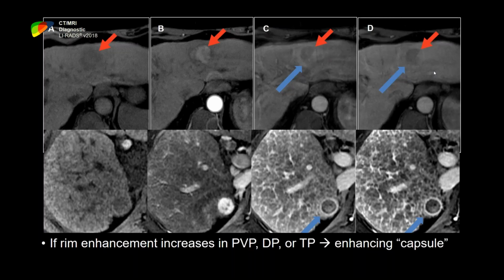I actually have seen cases of hypovascular HCC, and you can still look at the decreased enhancement in the later phases with these cases, and the development of enhancing capsule as well, or appearance of enhancing capsules. So I think this is based on the scenario that you're encountering. There is no one single answer for this, but you need to actually work it together with other features.